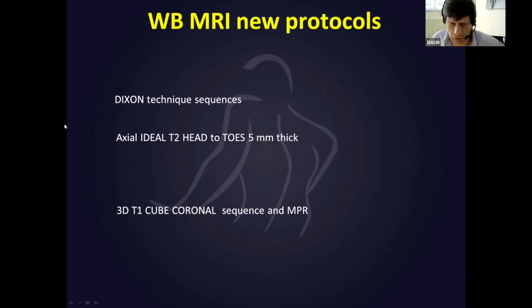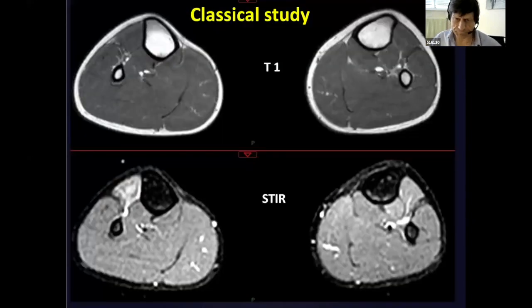You can also increase the anatomic description using three-dimensional T1 slices, and with this type of three-dimensional sequence, you can perform multiplanar reconstruction in order to correct deformities, to obtain more comprehensible anatomy, or to perform 3D reconstruction in order to have global analysis.